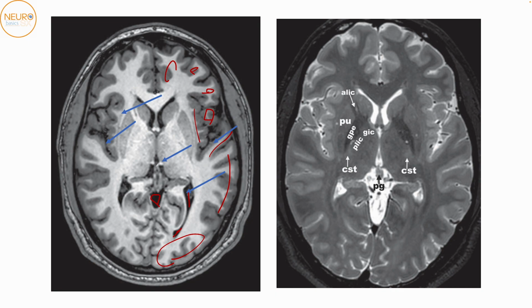Okay, this here, this very bright, very obvious thing on T1 is the habenular nucleus. Okay, and these are the columns of the fornix. This another very bright thing over here is going to be the anterior commissure. Okay, so both the commissures, your anterior commissure and the posterior commissure, are quite bright on T1 and they'll be very easily identifiable.